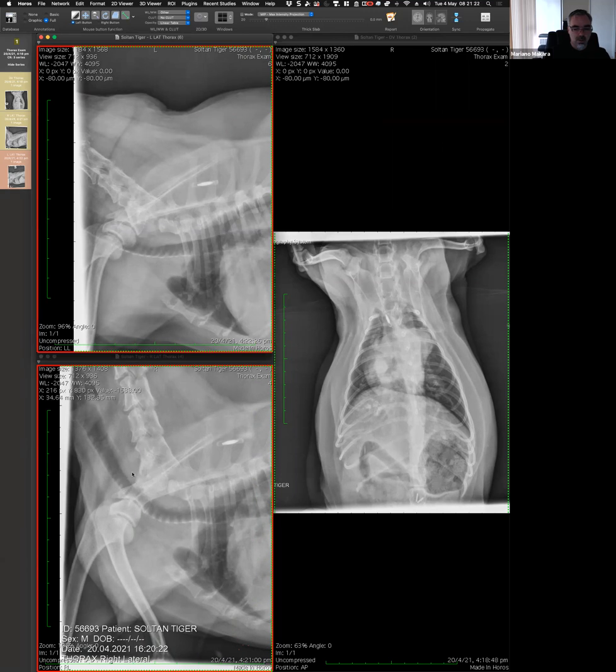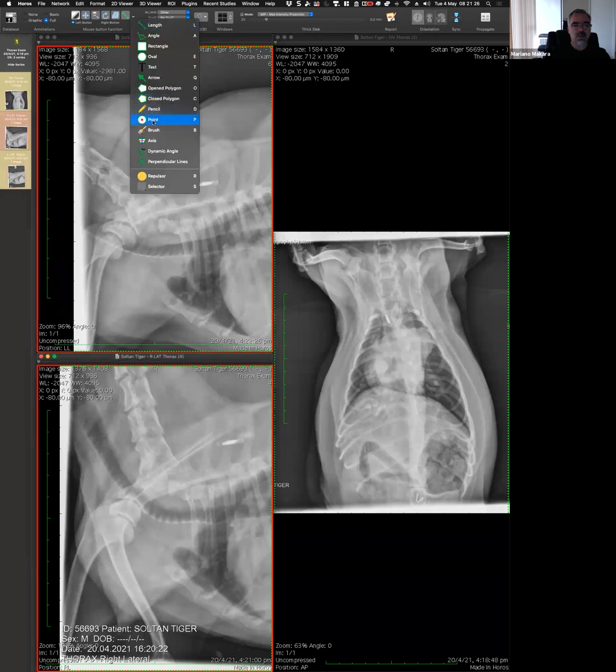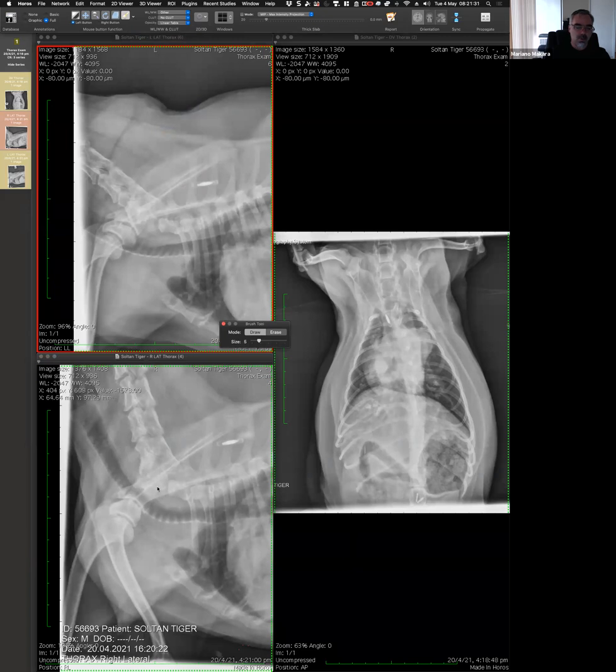So probably the way to describe this is, let me draw. Unfortunately, we don't have a cross section of the trachea, but there are three things that can happen. One is something like this, which is going to be the normal trachea. This is a cross section. If you take the X-rays from the side, like in this case, the lateral projection, you're going to have three lines.